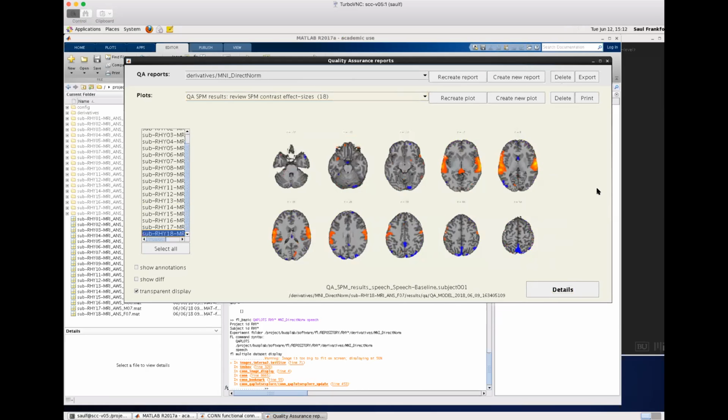So in that case, they won't be included in the list of valid and invalid scans by ART. But there is another way to enter invalid scans, which is to let ART forcibly include a predefined list of scans into its own defined list of invalid scans, and when you do it that way, those will be counted towards the number of invalid scans in this plot.